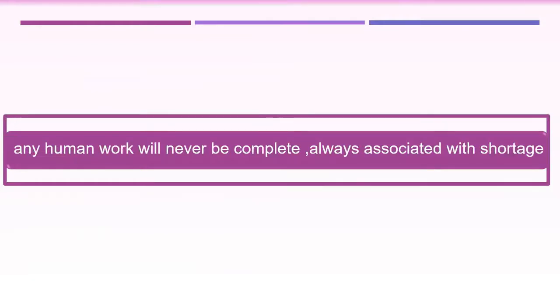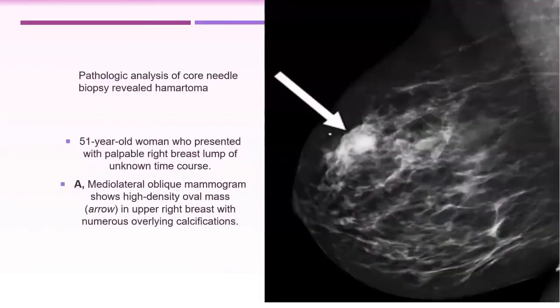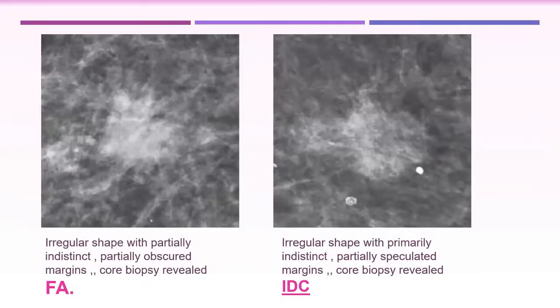Doctor Rabab, sorry, the fibroadenoma, I couldn't appreciate the microcalcifications. Yes, it is not very clear, but it is there. There are microcalcifications. Okay. It is amorphous. That is why it is not very easy to detect. Yeah, I could see it here, close to me.